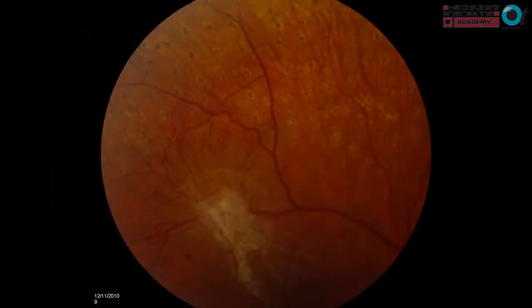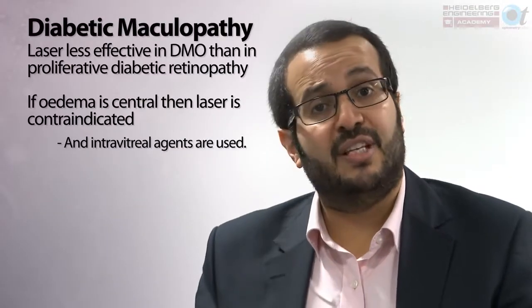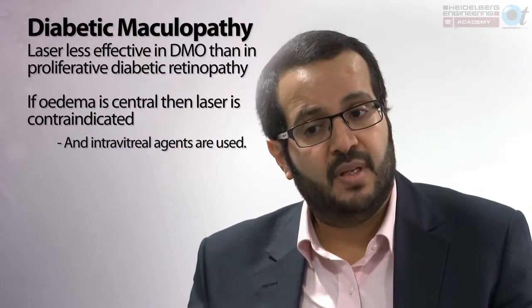And this is a color photograph post-laser, and you can see those areas of retinal neovascularization elsewhere have regressed satisfactorily, and the patient's maintaining excellent vision at 3 to 4 years post-laser. Let's turn our attention to diabetic maculopathy.